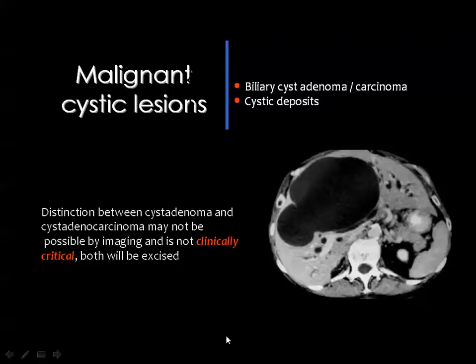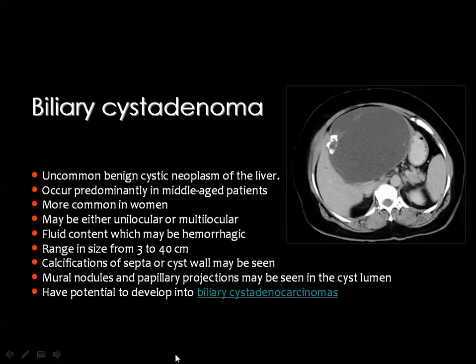This is, in my opinion, the most reliable sign to diagnose this cystic lesion, particularly when it is unilocular. Then these are the criteria of biliary cystadenoma.